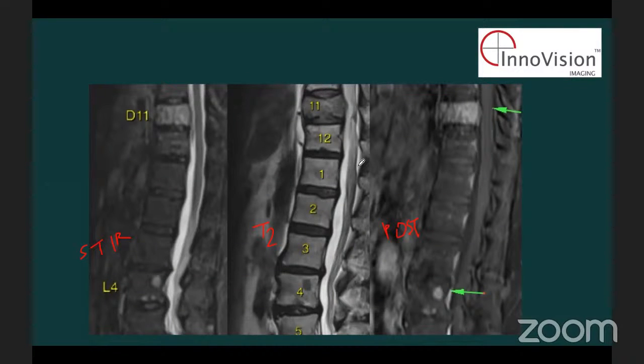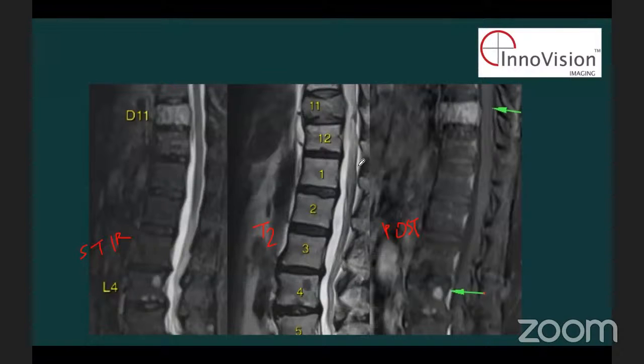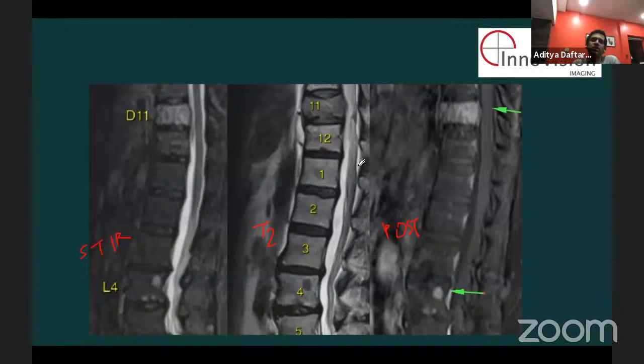It is a non-contiguous lesion, more towards a pathological fracture, because the osteoporotic fractures are mostly contiguous. So this is not a fracture. This is just another lesion in the bone. Yes, another lesion. But you're showing two different lesions within the bone.